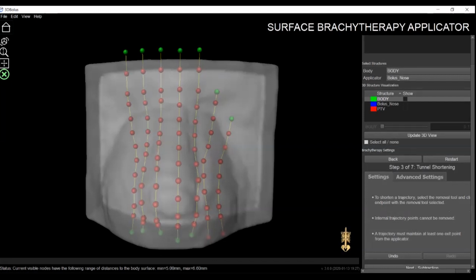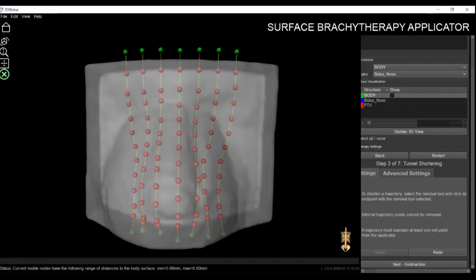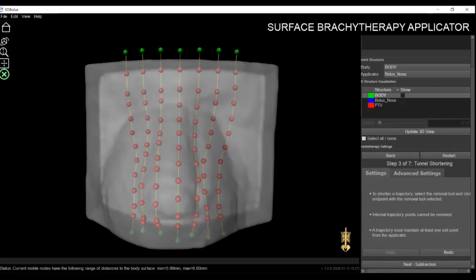Another new thing that we incorporated in the UI UX are undo and redo buttons, which are local, and you can always undo or redo the current local progress that you're making within any of the steps. But also you can go back to the previous step.